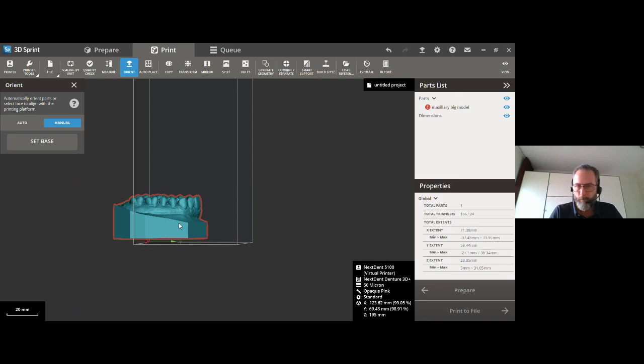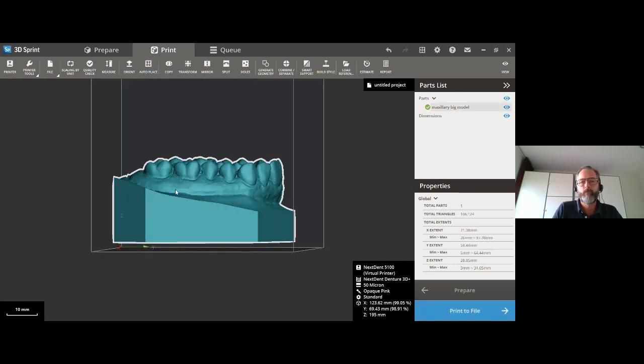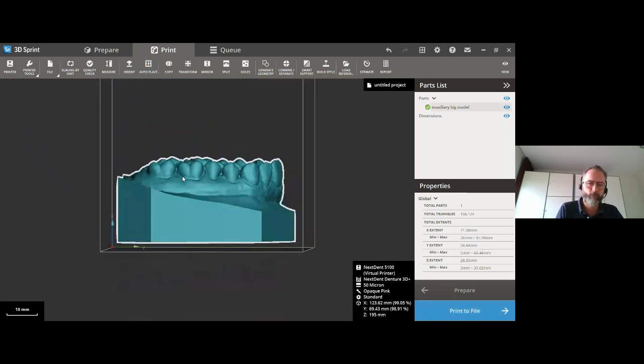Okay, thank you very much, Menno. A second question that came in is: the software generates supports automatically, so there is some logic and knowledge behind that. When you start moving these supports around, are we still safe? Are we still sure that it's printable? Can we see this somewhere?